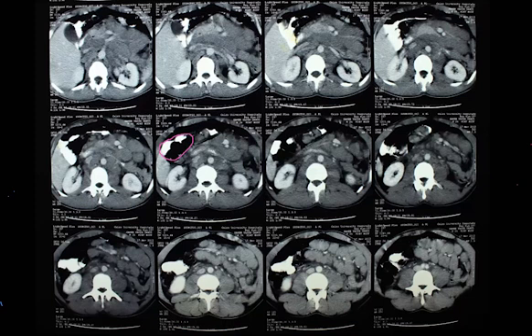Okay, so it's only these, and all the black is not bowel? No, all this black is not bowel. All these are lymph nodes. Even these, for example, I'm not sure about the ones at the bottom. Probably these are bowel loops, with mesenteric vessels in between. I think these are bowel loops and they're not the same density as the lymph nodes.